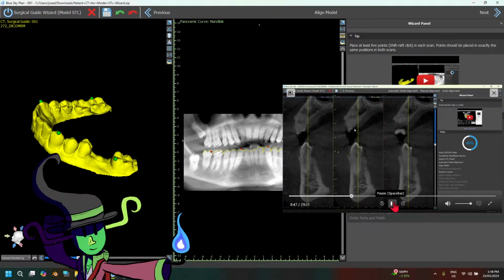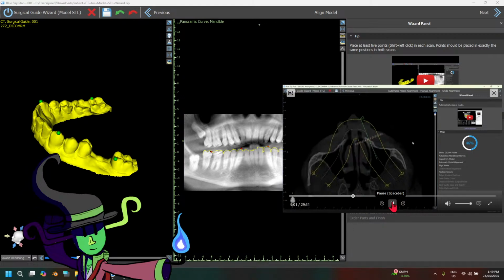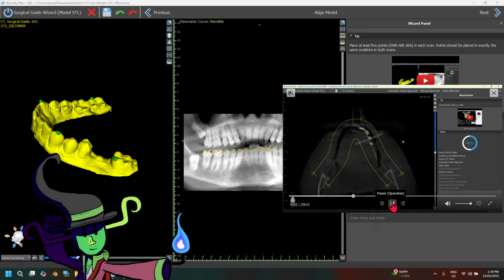You probably won't have to use this a ton, especially in a routine case, but if you hold down the right mouse button and push forward, that gets your zoom. So you can zoom in, zoom out. I got you, Corey. That's going to be the same functions in all of these windows. Here I'm in the axial. I can either use this slider or I can use the scroll ball. I'm going up and down through the volume.